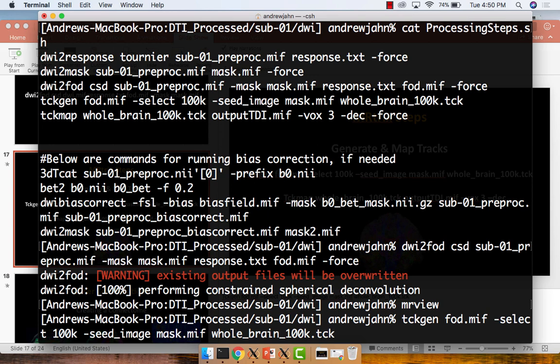But as you'll see, obviously you're going to get some measure of false positives, right? So some of these tracks that are being seeded may actually not represent, say, a track that actually exists. There's a fair amount of noise. You are going to have some false positives. And at some point in the future, we'll talk more about the thresholding, how you do this group analysis. And conceptually, it's very similar to fMRI data. But for now, I've got to force that.